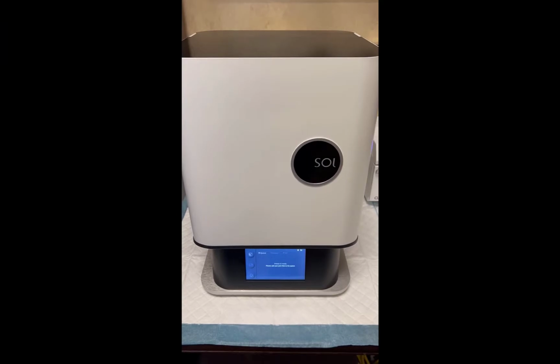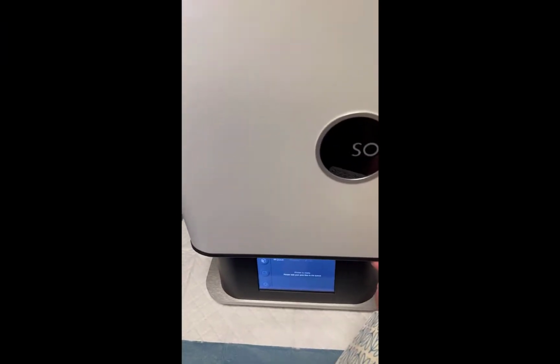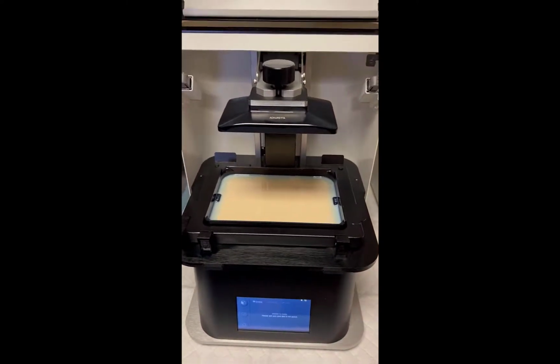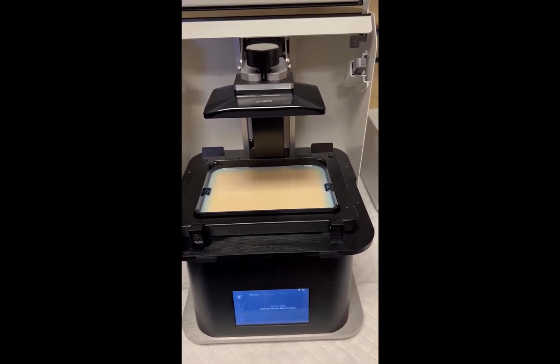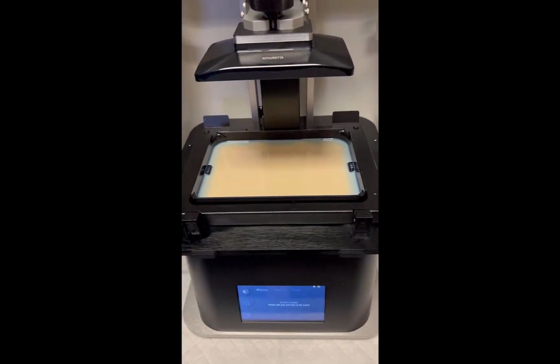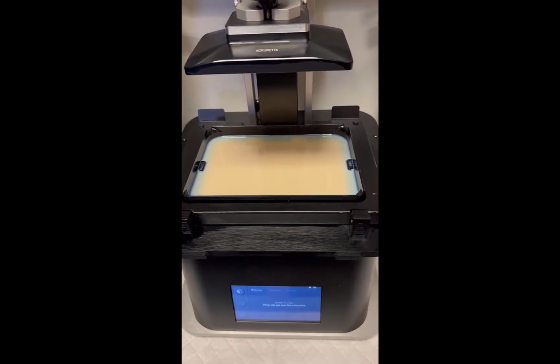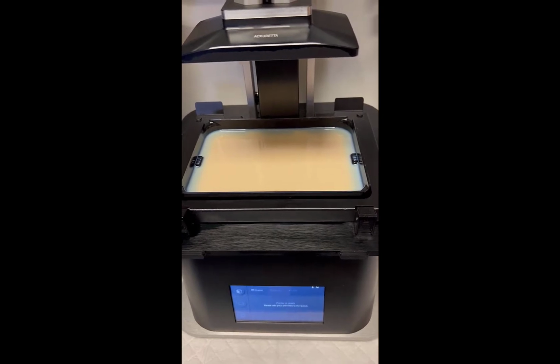Okay, so this is probably something that would go under tips and tricks. I'm going to show you how I do a cleaning cycle. I do this before each print. It burns about $1 worth of material before I get started, but you know, if you're going to do a long print like a denture base or teeth, it could be up to 3 hours depending on how you orient your parts. It's definitely worth it to get this done instead of wait 3 hours and then find out you had a misprint. That can be pretty disappointing.